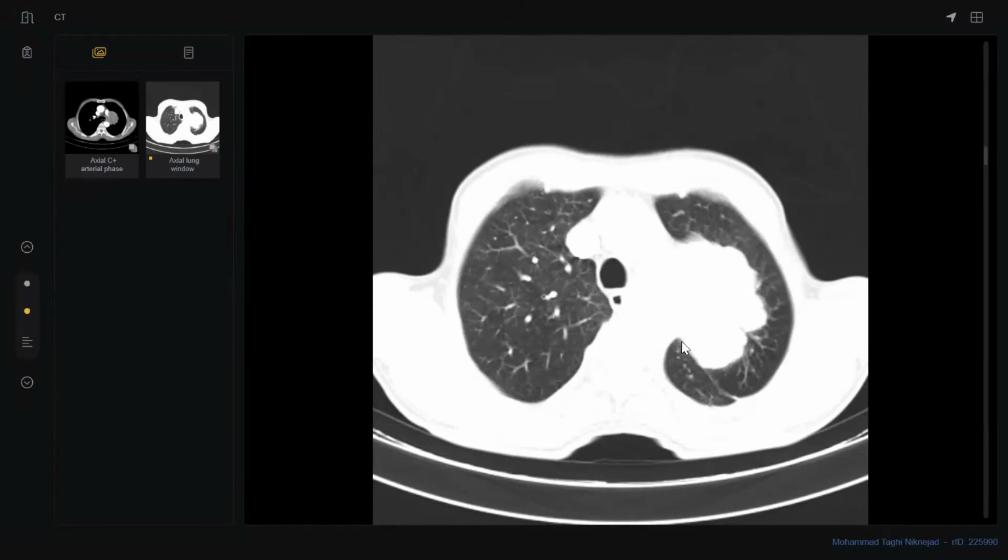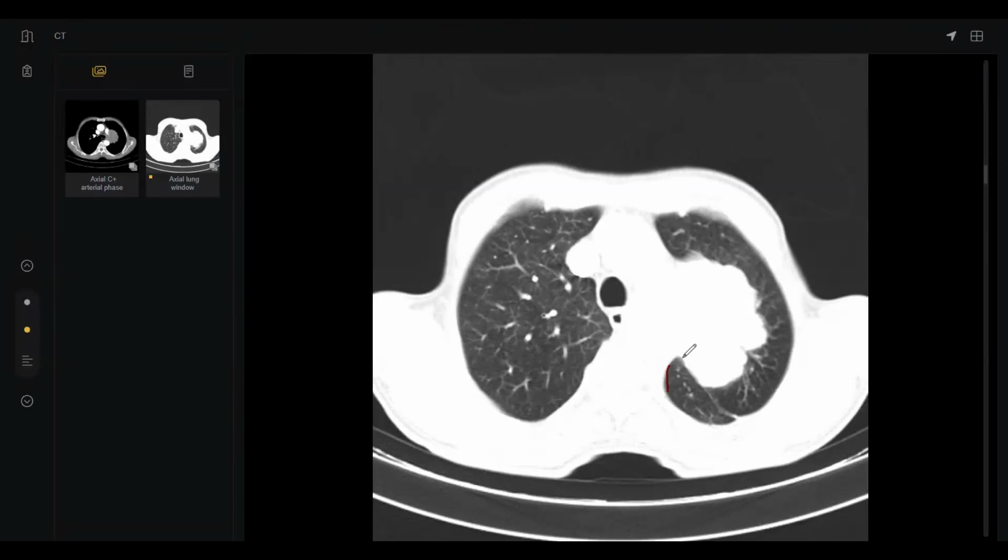Look at the angle. This is acute or obtuse angle? These are obtuse angle. This one is acute. The anterior one is obtuse. This angle is acute, correct? Yes, sir. So is this a mediastinal or lung mass? Then it can be a lung mass. Okay, number 2: look at the lung itself.